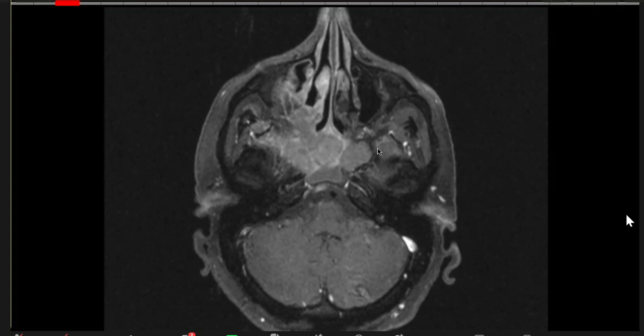So we used STIR and T1, right? STIR will be by definition fat saturated. T1 is a beautiful sequence because of fat. It shows us so many things, particularly in tongue carcinoma, etc. At times, you see it without contrast much better than post contrast because of fat.